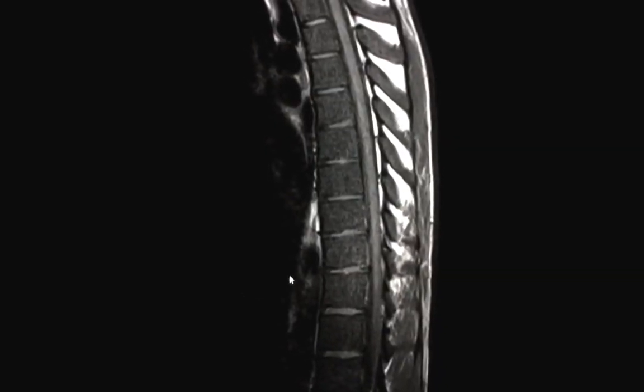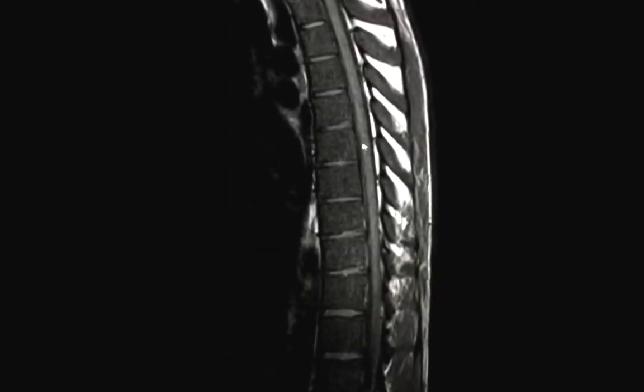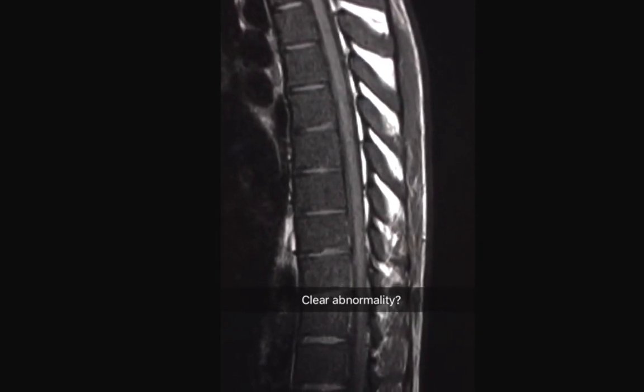This is a sagittal T1 of the thoracic spine. T1 is known by the dark appearance of the CSF fluid. And this is a T2 weighted MRI from the same patient. Notice how the fluid, the CSF surrounding the spinal cord, is bright. Have you noticed anything that is strikingly abnormal on this MRI?